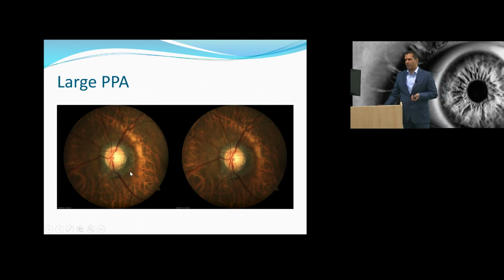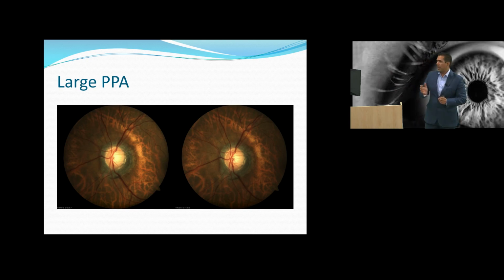So peripapillary atrophy can come in all shapes and sizes. They don't have to be restricted to one particular region. It can be anywhere around the optic nerve head. It's right outside the optic nerve head. It's not further away, not a few disc diameters away. It should be around the optic nerve head, and it basically consists of zone alpha and zone beta.